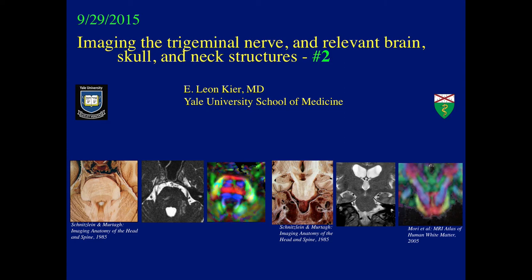Today I'll be talking about the cisternal portion of the trigeminal nerve. In my prior lectures and the future lectures, I'll have a lot more anatomy than today. Because the cisternal portion just passes through the CSF, there's not too much anatomy to describe, and most of the talk will be about pathologic cases.